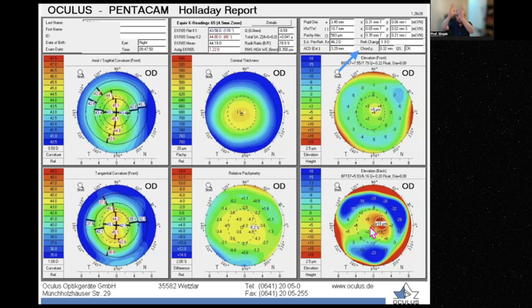Immediately it will bulge out unpredictably, which means it may bulge out centrally, making something similar to the cone, or maybe on the side. So the patient will suffer from irregular cornea and coma and so on.